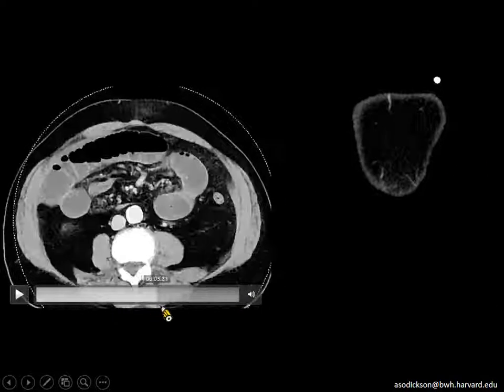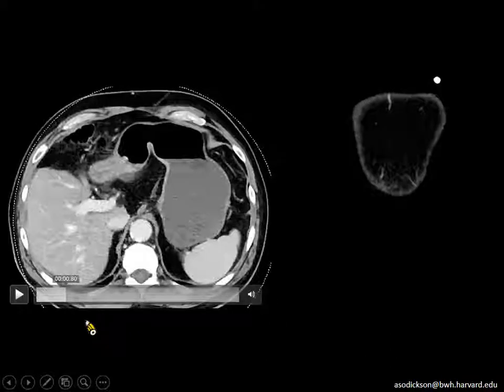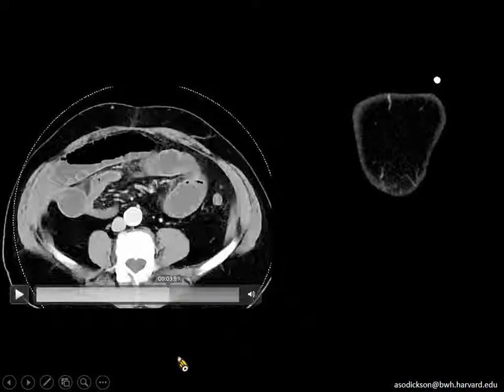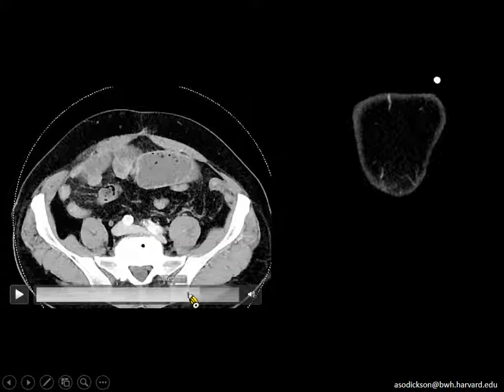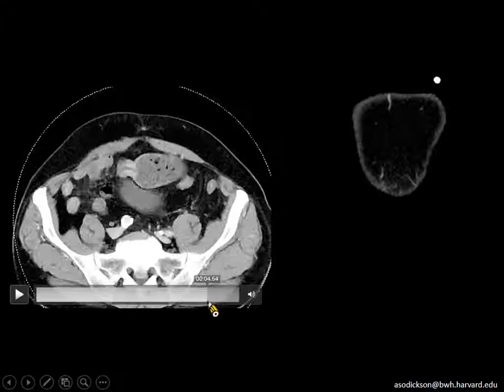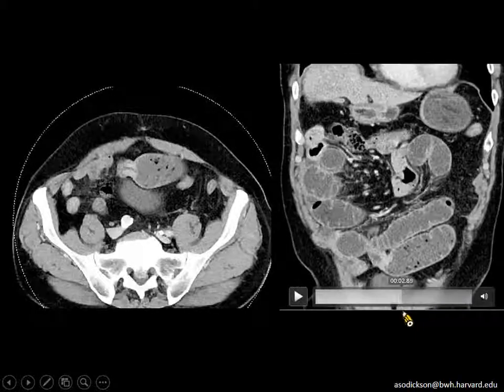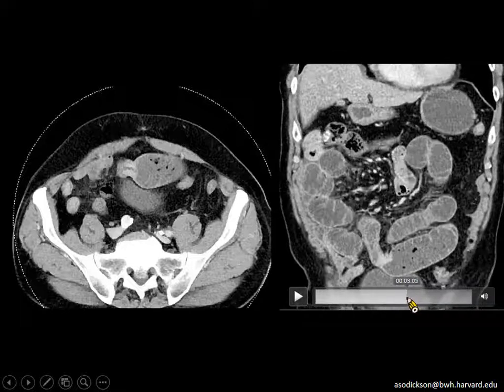All right, here we go. So, bowel obstruction, yes. We have distended small bowel loops. We're looking for our transition point. If we follow this out, we see some area of fecalization here, and we see that we come to a very focal transition point right here. Here it is on our coronal images. Right here is our transition point. It, in fact, does not look terribly severe.